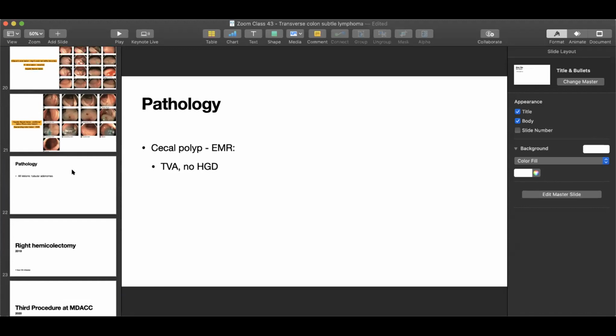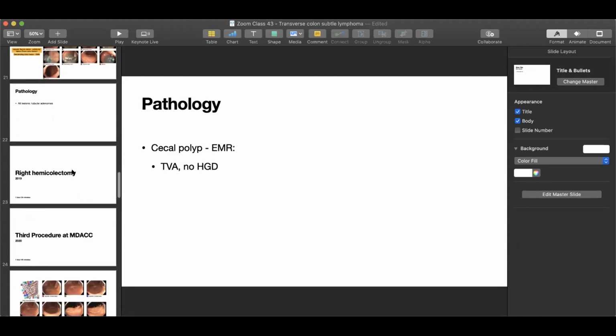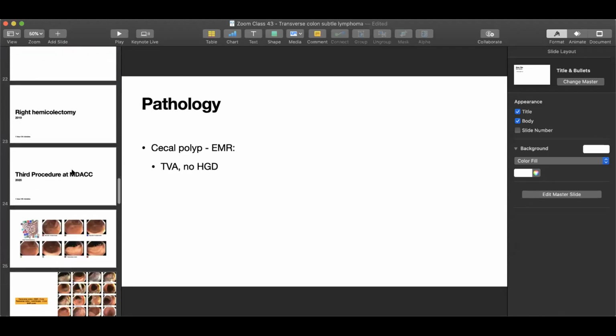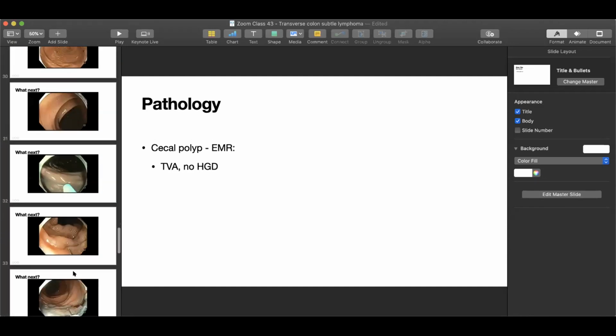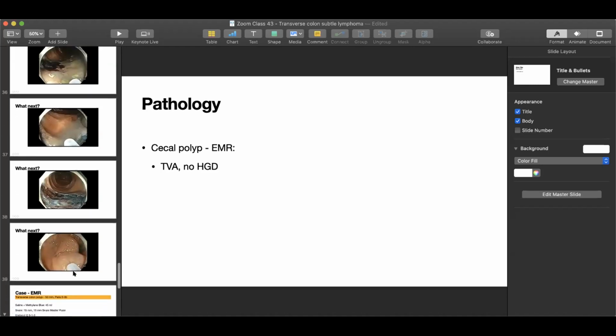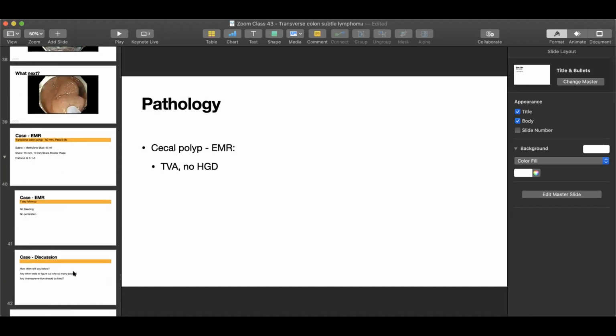Yes, but this is the only specimen that I've looked at. It would be great to have reviewed the resection, because the resection would have some lesion, but then adjacent tissue to look at, and the orientation would be the best. I'm a little uncomfortable just labeling it as such based on this specimen, but it's very unusual, and there were no fragments that had non-dysplastic areas of SSA, therefore I couldn't place it into SSA. Although, I definitely showed you areas that made me think of the possibility of SSA.